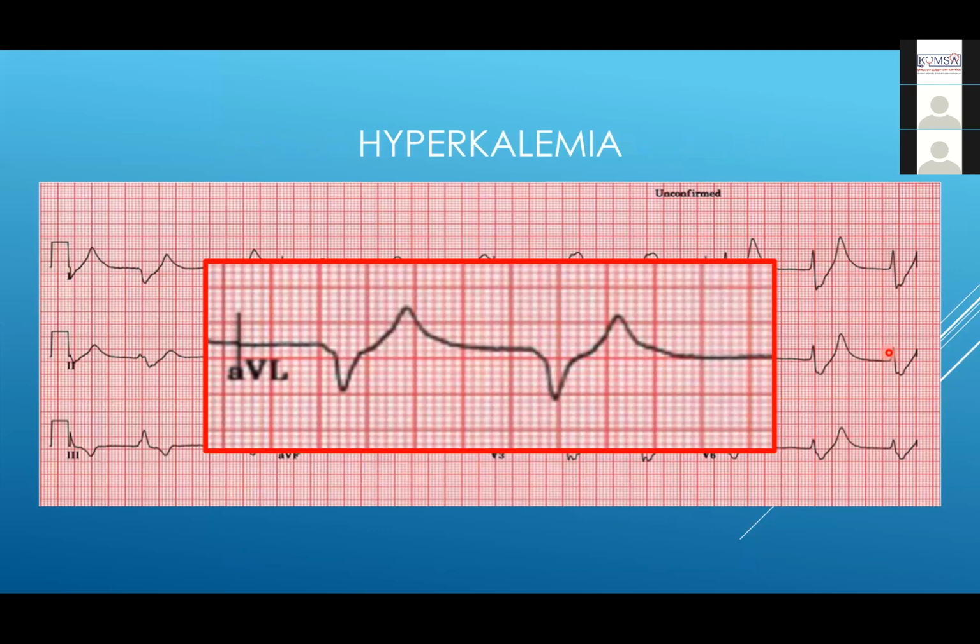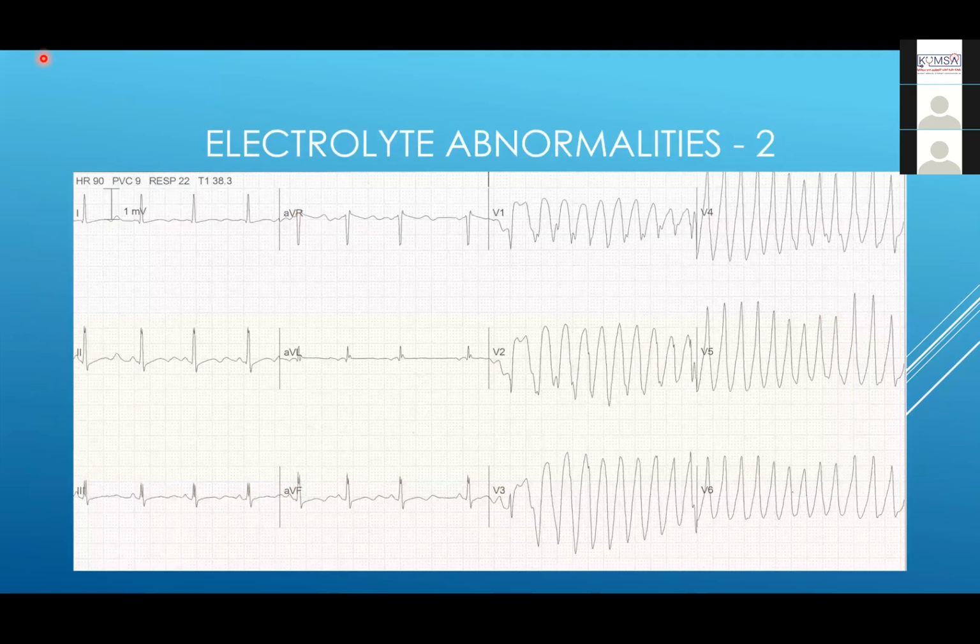So this ECG is in 2 parts. We'll take one part and then we'll talk about the other parts. So well done Mira, that was very good. Does anyone else want to try interpreting this one?